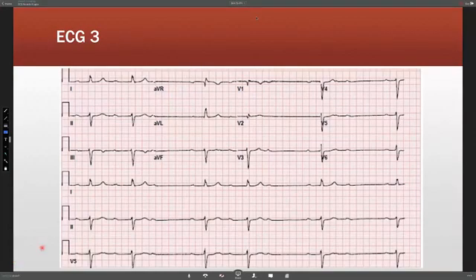So to go over this EKG, there's a P wave and a long PR interval. I'm pointing to lead 2. Can you see my laser pointer here? Yeah, we see it. Prolongation, yes, the PR prolongs. And then there's a dropped beat.